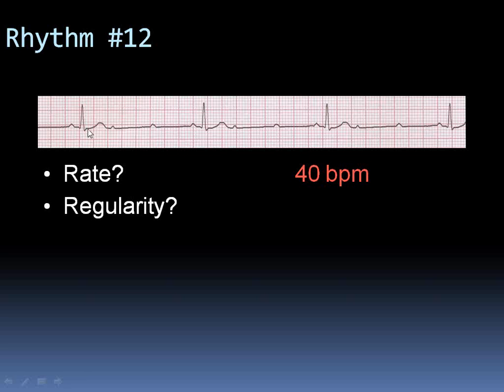See, this is conducted, these two are not conducted. This is conducted, these two are not conducted. This is conducted, these two are not conducted. This rhythm, you see a PR interval that is pretty consistent. This is normal PR, this is normal PR, it does not lengthen.